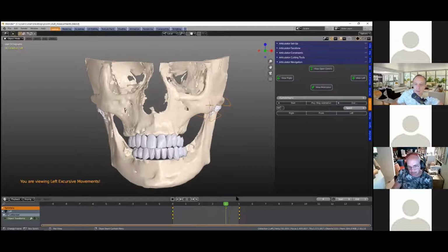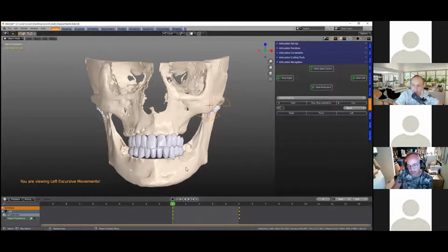Yeah, okay. So you mean making a dynamic cut, like using all of the animation? Yeah, we can try it out. Well, give it a go.